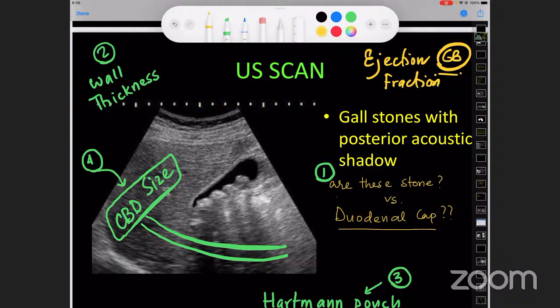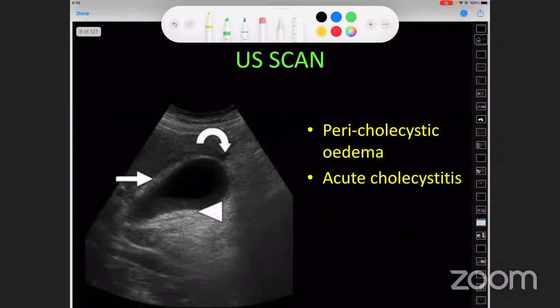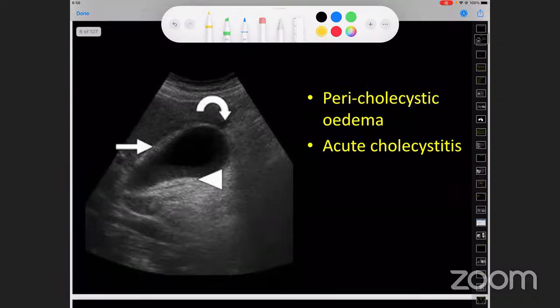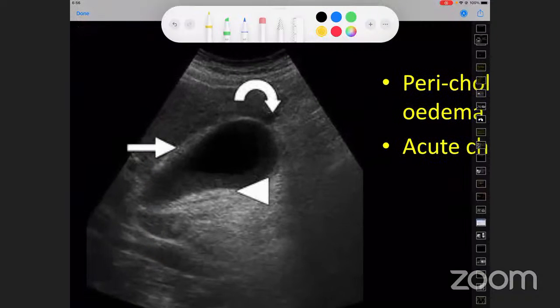And on this one, I will change gears a bit and take you to the emergency. This is a patient with an acute cholecystitis, and as Dr. Bakshi was mentioning, an acute pericholecystic edema. For the benefit of the audience, I will mark the edematous tissue by this color so that you can appreciate that this is the edematous tissue around, which appears technically a little more black in contrast with the liver. Avik, just correct me if I am wrong. If this is the gallbladder wall, I'm marking the gallbladder wall. Is this the edema fluid?